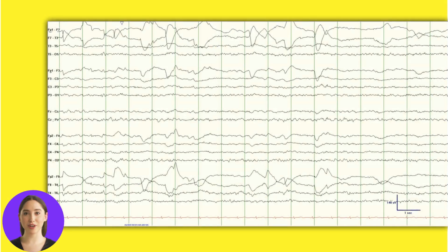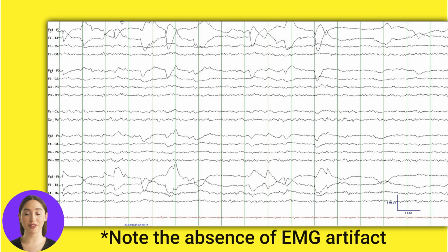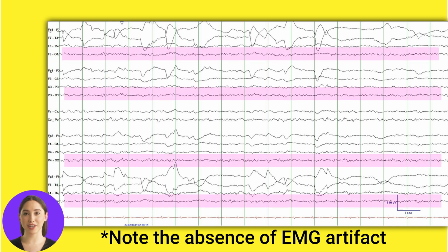Within EEG, the REM stage of sleep is composed of low-voltage polyrhythmic activity, as well as a background that is remarkably absent of EMG artifacts. Some features are similar to drowsiness and N1 sleep. This includes periods of alpha band activity, though of slightly slower frequency than in wakefulness.